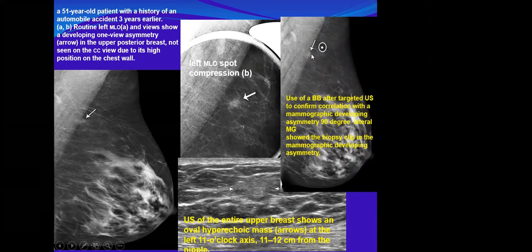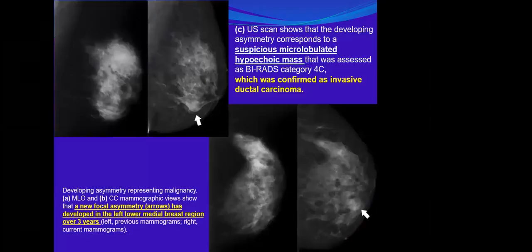Yes, they had done biopsy. You see, this contained the biopsy clip, and this is a BB. It confirmed that the biopsy was taken under ultrasound, and they put the clip to make sure the biopsy is taken from the same asymmetric finding. So, ultrasound-guided biopsy revealed fat necrosis.